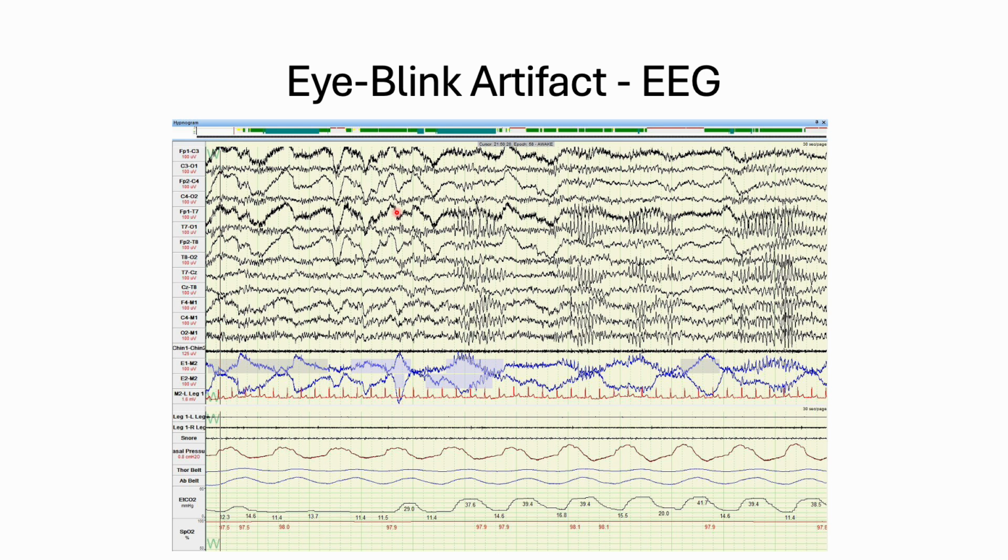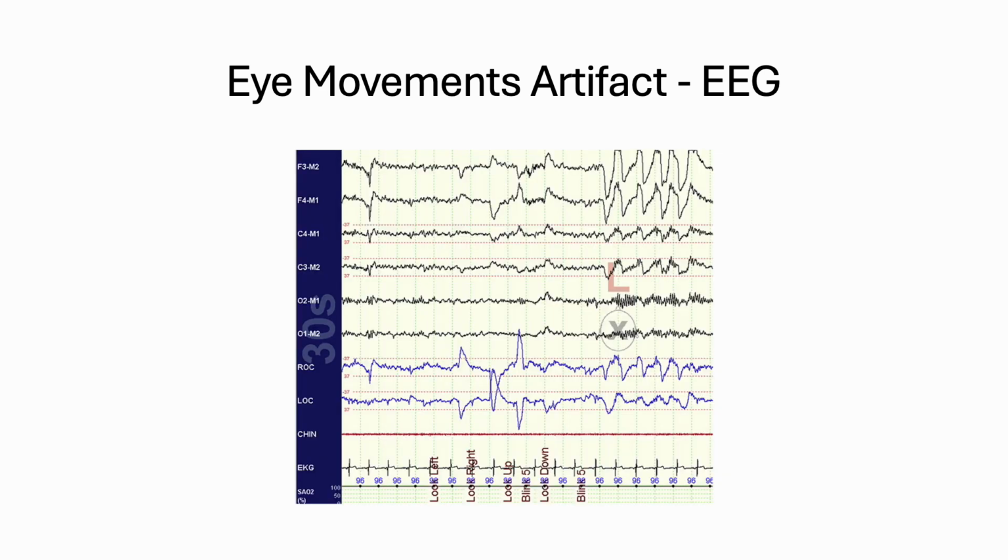Other than that, you have alpha, and that looks like it's showing up in the eye movements, which is interesting. I think that's it for this one. Here's some more eye movements.